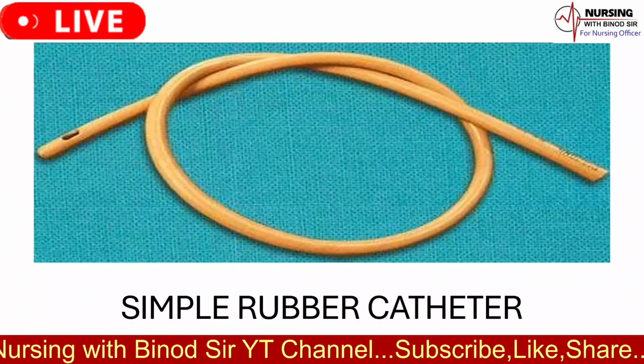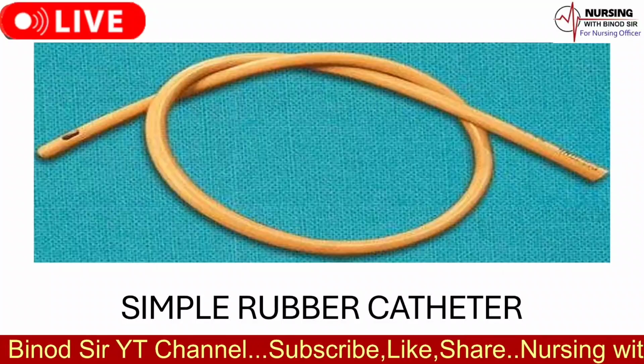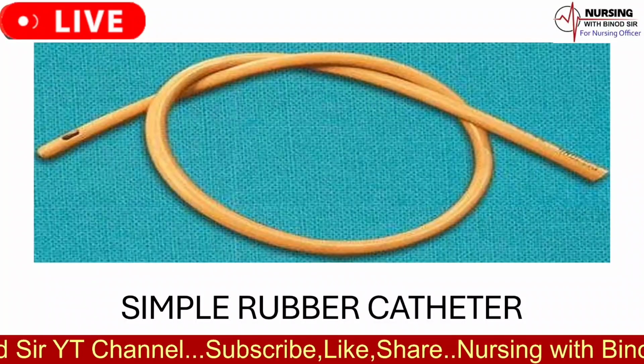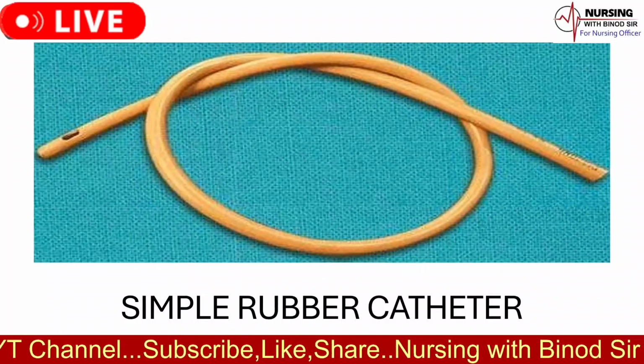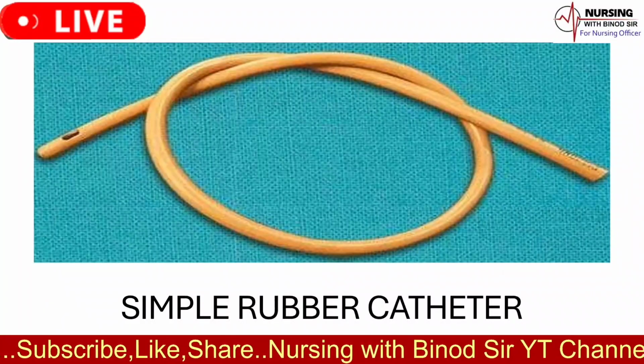Other uses: A. As a tourniquet. B. To administer O2 when a nasal catheter is not available. C. As a mucus sucker, when it is attached to a mechanical or electric sucker.